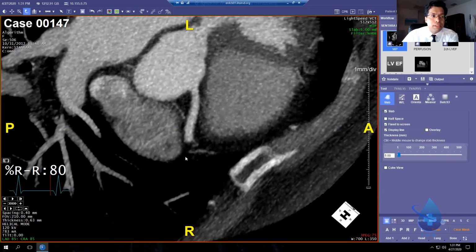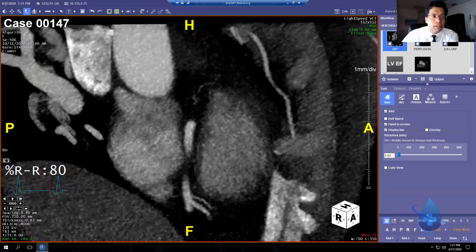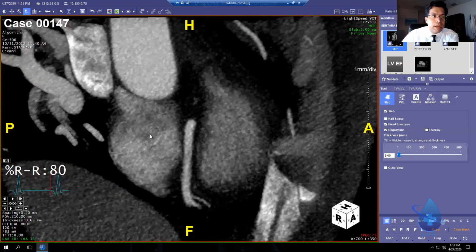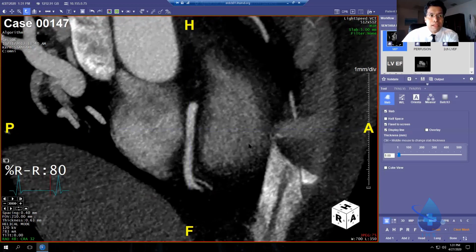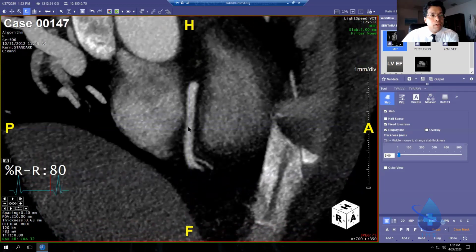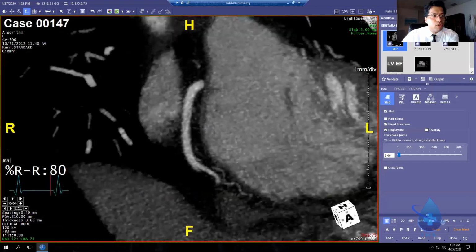I want to follow the distal and mid, so I'm going to left click and rotate in the opposite direction, rotating the rest of the heart into view. So here is the mid RCA. This is the right atrial appendage. This is the right ventricle. If you are vessel walking correctly along the natural grooves of the heart, there will always be different chambers on either side of the blue lines. In this case, right atrium and right ventricle. Okay. Now we're going to clear the mid RCA of any lesion. So we left click and we move forward and back, move forward and back.